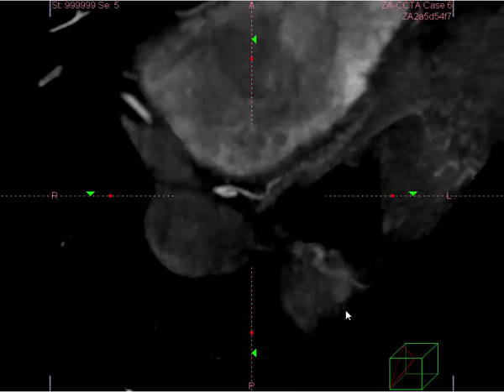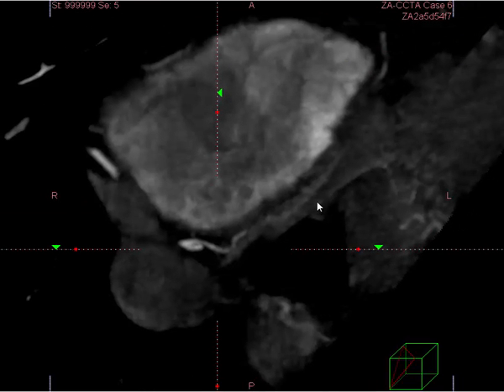So what we have here is a 47-year-old gentleman who has atypical chest pain. There's no evidence for obstructive disease. However, he has mixed, possibly ulcerated plaque that's non-obstructive in his proximal left anterior descending, and he needs to be very aggressively treated for his risk factors, including treating his cholesterol.